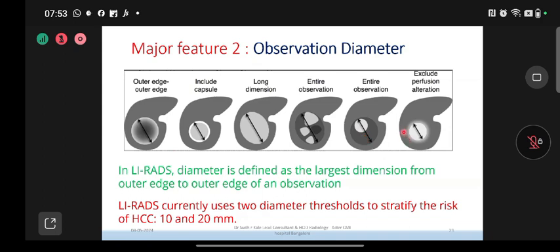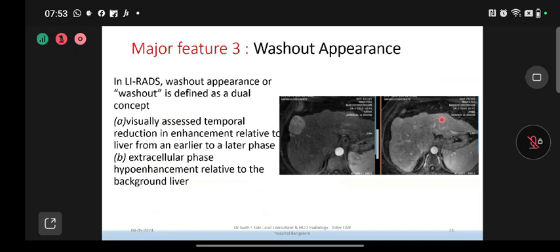And sometimes normal liver parenchyma can show a little bit of corona-like parenchymal enhancement. Those can be excluded. If there is subtle enhancement without mass effect, only the lesion nodule is to be taken. So these are the precautions we need to take when you are measuring the lesion.